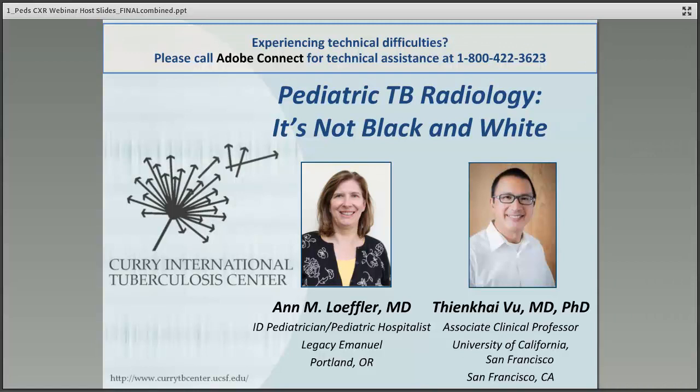Vu agrees with me, I didn't ask him ahead of time, but if you're looking for intrathoracic lymph nodes, you need to use contrast, because that's going to differentiate that nice, heterogeneous, somewhat necrotic lymph node from your vasculature, which is sitting right next to it. So just keep that in mind.